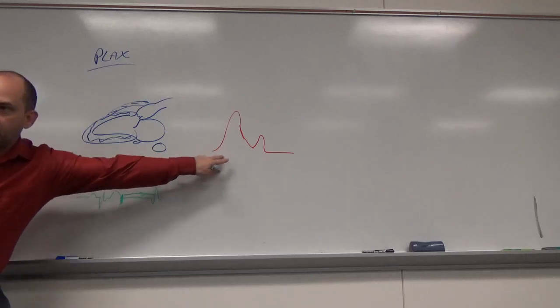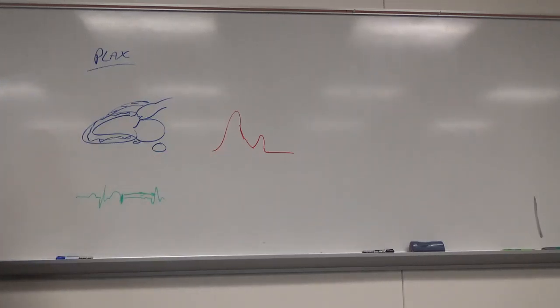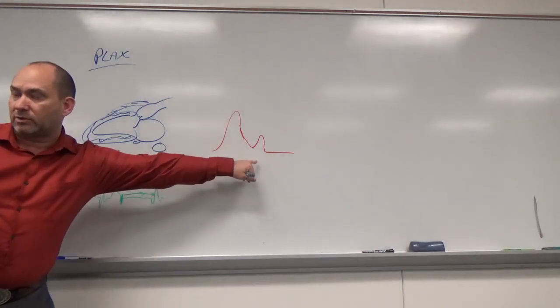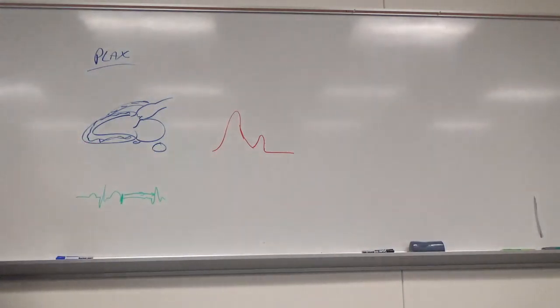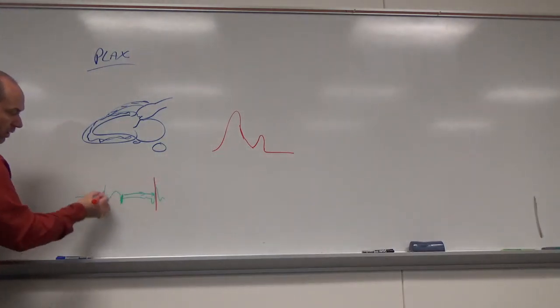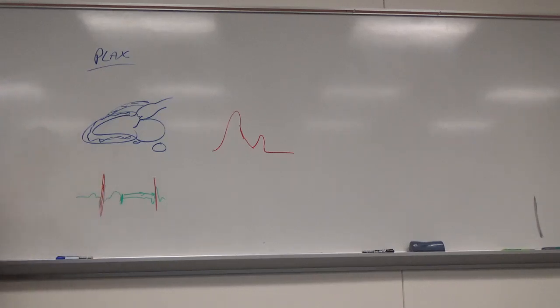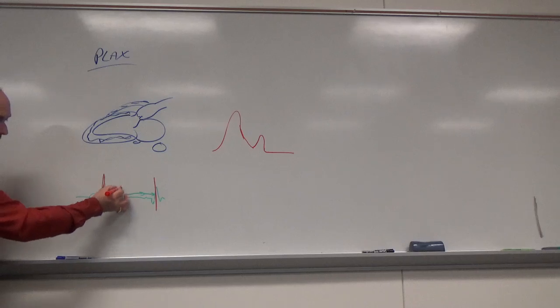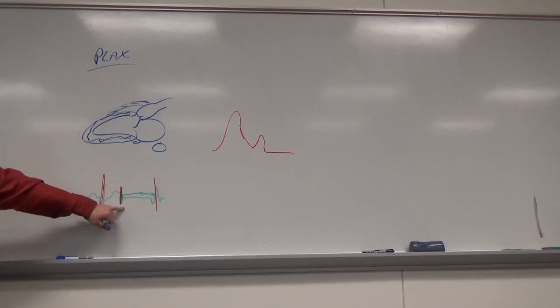So I asked where it is. Early diastole here gets some fluid in there, yes. Okay, but is it all the fluid? It doesn't happen until after the A wave kicks. Then we get that rush of the A wave at the very end of diastole, which happens to be right on the QRS, because the QRS will fire, but the mechanical contraction is a delay from that until just a couple of frames after that QRS. So end diastole is really right on the QRS. End of systole is actually right at the end, just before the opening of the mitral valve.